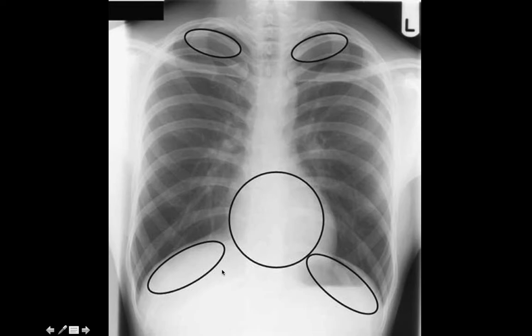And even if the patient is well inspirated, under the diaphragms there are lung fields, if you can remember the lateral view of the lung or the anatomy of the lung, it goes behind these areas. Behind these areas are also lung fields, but unfortunately we always do not look at these areas. Sometimes we consider this one a fundic shadow and this one the liver shadow, so that's all. But this is a very common thing that we miss.